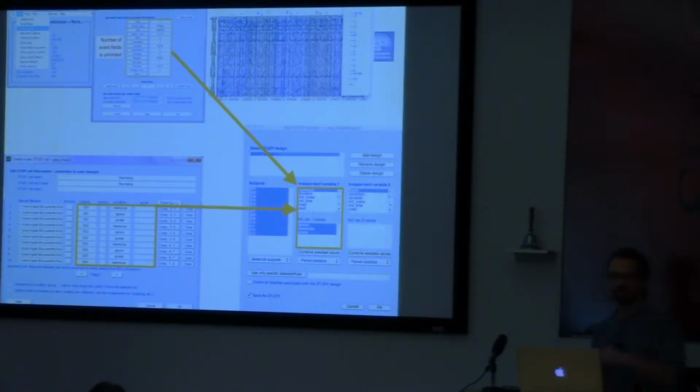So it's going to go in your EEG data and your events, and it's going to look at all your fields of the time locking event, and then it's going to allow you to select trials based on that information here. So for instance, if you have duration of event, you can just select duration here. That's a continuous variable, so that's a bad example.